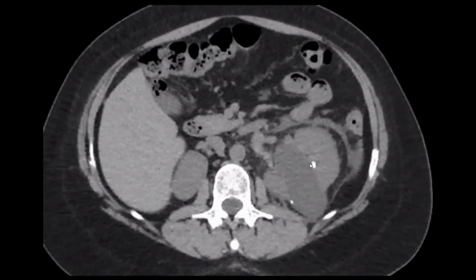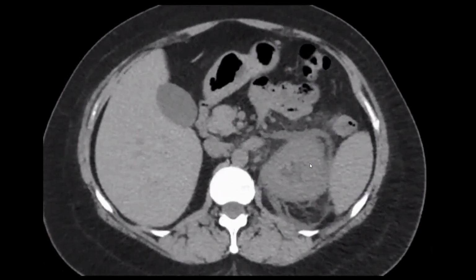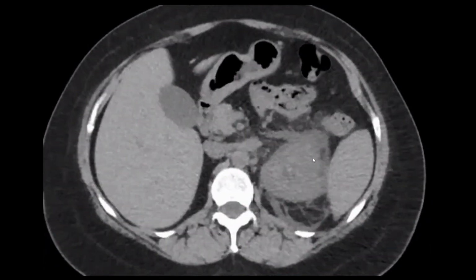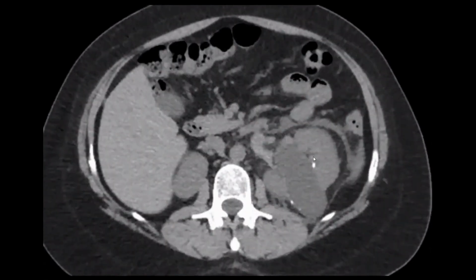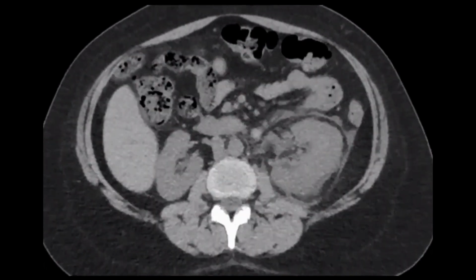Can you put it with the gonadal vein as it is draining into the left renal vein? It's draining into the left renal vein. Very nice. So it might be thrombosed as it is significantly hyperdense, or it may be enlarged due to this mass, and there would be some varicoceles inferiorly. But this scan is non-contrast basically.